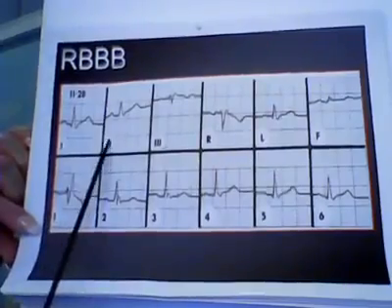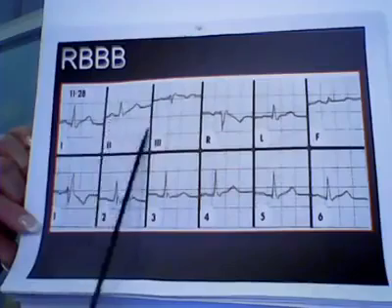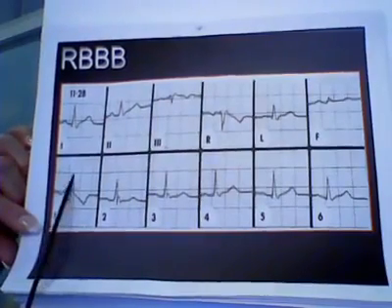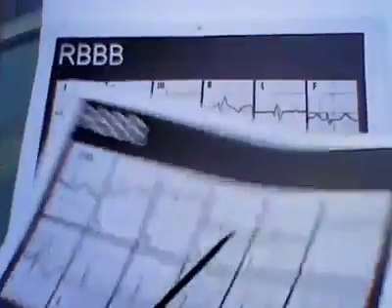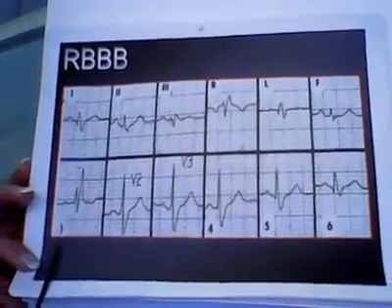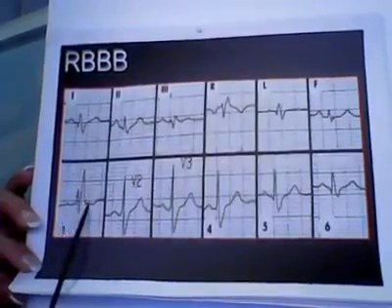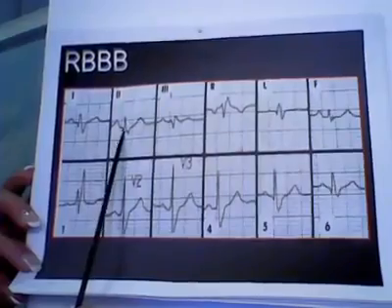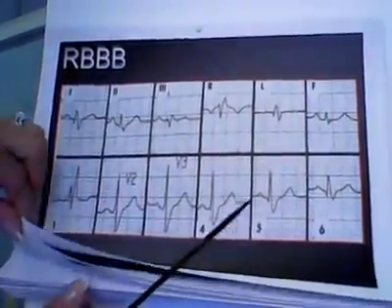We would never be in lead 2 or any other lead because, you know, this doesn't even look like anything's wrong with the guy, right? So you look at V1, you got a little r followed by a big R. Let me show you another right bundle branch block. V1 or MCL1 or Lewis lead, we got a little r followed by a big R. This is a right bundle branch block. Look at lead 2, right? It's not wide, right? You would never know he has a right bundle branch block by looking at lead 2.